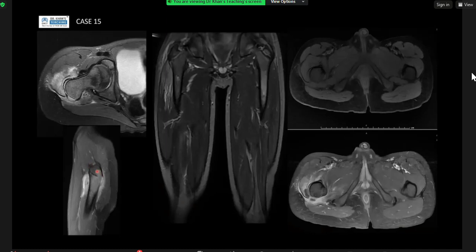Okay, so this is the apophysis, and this would be the metaphysis, as you normally know in your long bones. Soft tissue edema, that shows you again on a coronal. Now, things to be aware of: in a kid, as in osteomyelitis in adults, your T1 is your friend, because focal areas of low T1 signal suggest a marrow process, which can be infection or malignancy. It should be iso- or hypo-intense to muscle, which suggests it's a marrow abnormality on T1.